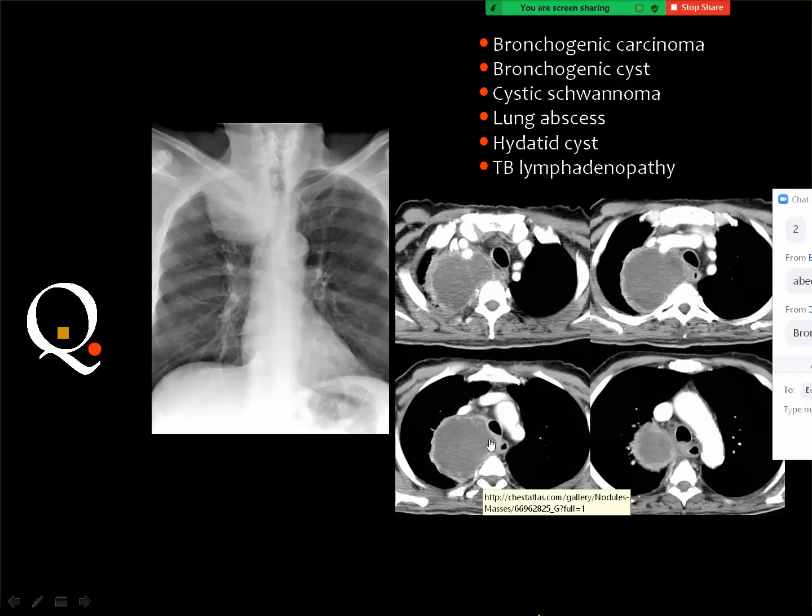It is almost totally cystic with a relatively thick enhancing margin. If this is an abscess, it should not extend inside the mediastinum. And I emphasize this fact many times. A pulmonary lesion cannot insinuate itself within the mediastinal structures, below the superior vena cava, pushing the trachea, and so on. But the mediastinal lesion will show these findings.